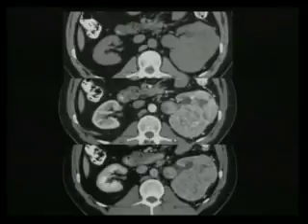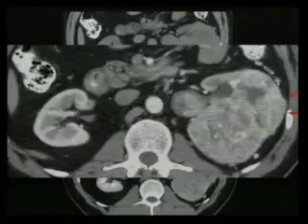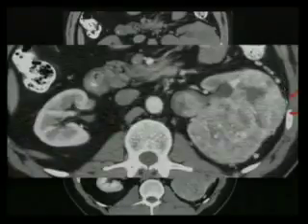This is the example. It's the same patient, and I said that a diffuse pattern is rare but can be possible, and this is one of the cases. You have an extensive tumor in which the margins are lost in most of the kidney. We can evaluate the amount of collaterals developed by the tumor, the angiogenesis of the tumor, and also we can say that this is a type 4 because it's affecting the gerota fascia.